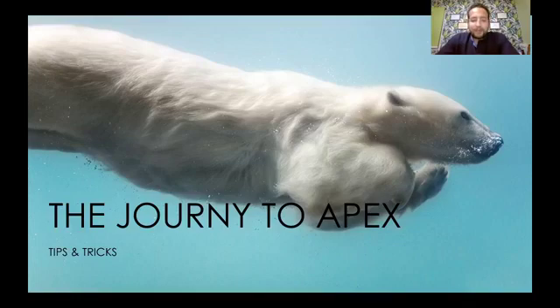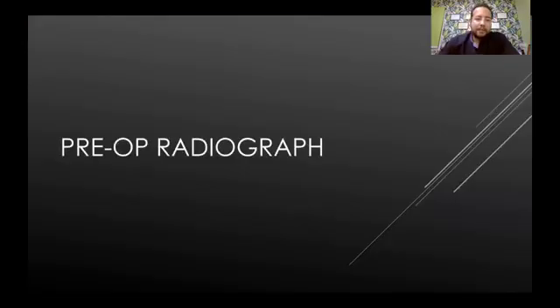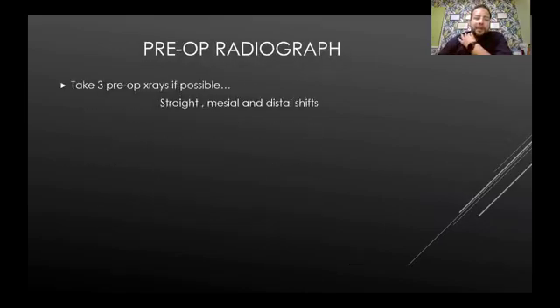Today, I will talk about some tips and tricks to help you in your journey to Apex. Let's start with the preoperative radiograph. My recommendation is to take three preoperative X-rays, one straight and two with mesial and distal shifts.